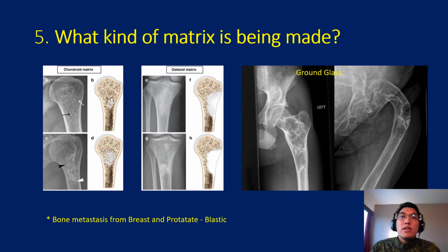For enchondroma and chondrosarcoma, there are frequently lytic areas interspersed between the calcified matrix. In cases of osteoblastoma, the osteoid matrix is mainly due to the host bone response to the lesion rather than true tumor bone formation. Osteosarcoma often demonstrates bone formation within the intraosseous lesion or in the soft tissue mass that is usually associated with the tumor.